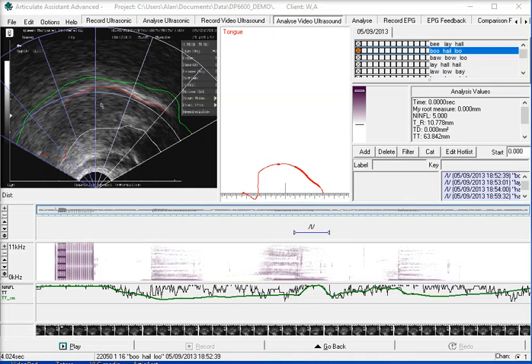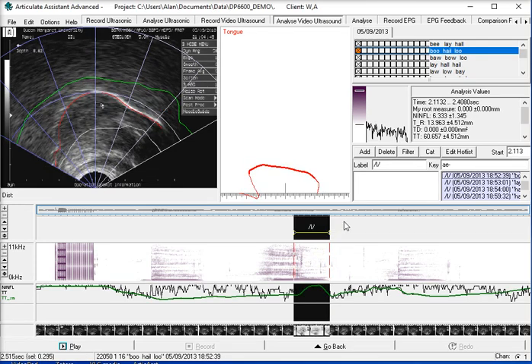Welcome to a tutorial on copying splines to the spline workspace, averaging and comparing them. Here we have a data set where we've labeled a set of segments, for instance L segments, and we've also taken note of the vowel context. So in this little tutorial we'll compare the L contours in two different vowel contexts.